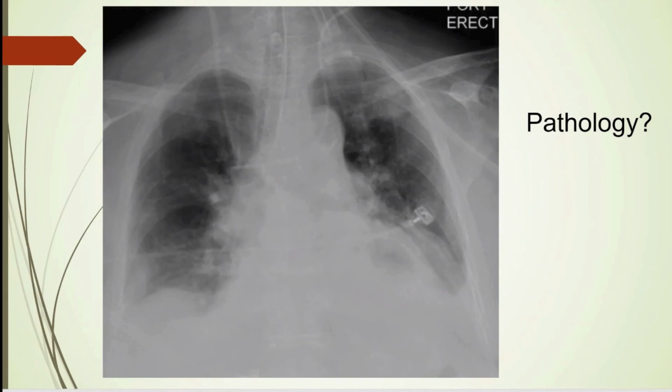All right, another chest x-ray. Let's see what's going on here. Looks like quite a bit. Let's start off with A for airway. You can see the trachea coming down. Looks like it bifurcates, right about there. This appears to be the carina. Looks like there's an endotracheal tube right here. So that's okay. It looks like maybe 2 centimeters above. I would rather pull it back a little bit, but it's fine. It's above the carina.